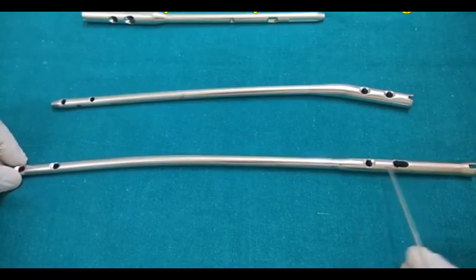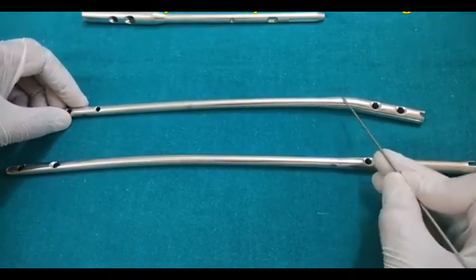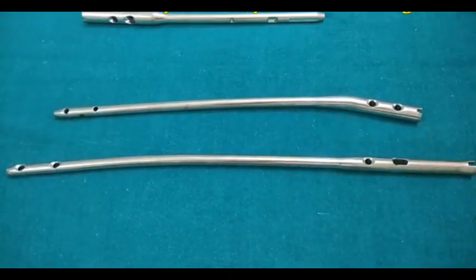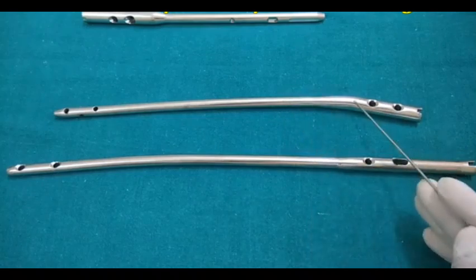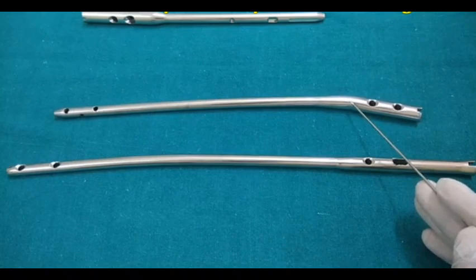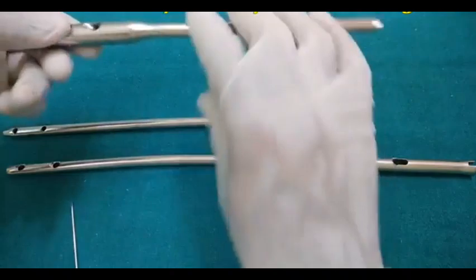You have two interlocking holes in the proximal fragment, two interlocking holes in the distal fragment. Now this one is the tibia nail. Now how to identify tibia? I have already told you that there will be a Herzog bend of 11 degrees at the proximal fragment because the entry site for the tibia is eccentric. Whereas in the femur, it is through the center of the medullary canal. But in the tibia, it is not through the center. It is eccentric, quite anterior to the center of the medullary canal. So to accommodate this eccentric entry point, they have made this bend so that you do not perforate the posterior cortex while doing the entry. So this is the main reason why there is a bend, and this is the tibial nail.